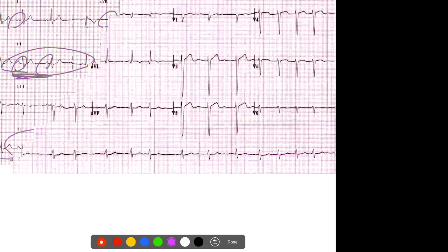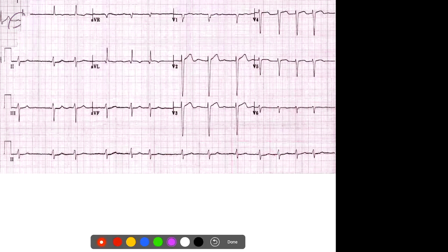All right, one more. To determine this one, if you were to look at it just at a glance, does it look regular or irregular? Irregular. Good. So we have to do the 30 block thing again, right?